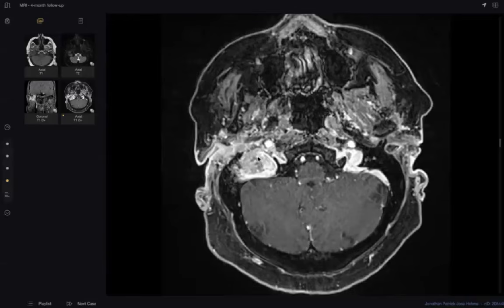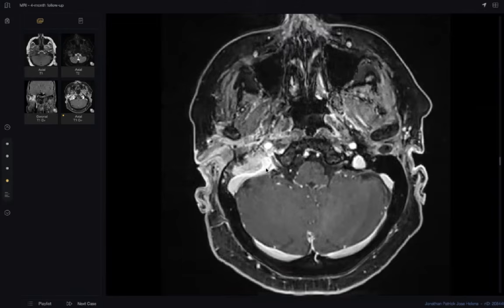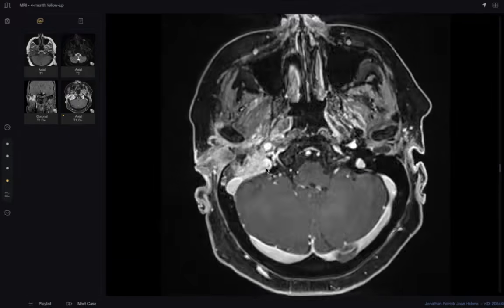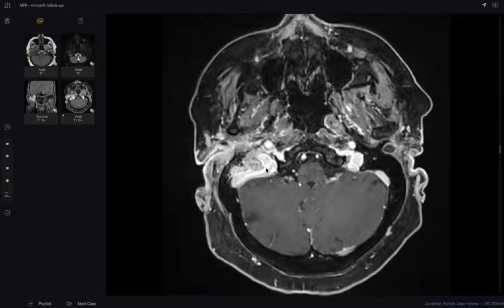Indentation of the vessel in this style may be a sign of infiltration. There are many signs of infiltration, like in the chest, if any tumor surrounds a vessel more than 90 degrees, it is a sign of infiltration. In the abdomen, more than 180. In the brain, I think it is severe indentation or compression like this. So you were very correct when you asked for MR venography, but this is, I think, more than enough. Okay, more than enough.